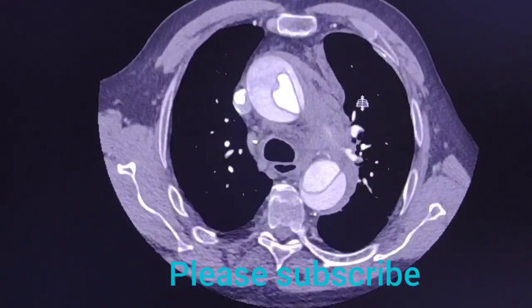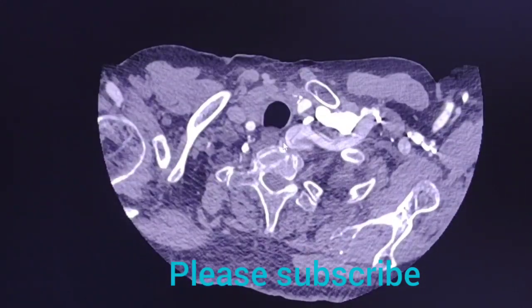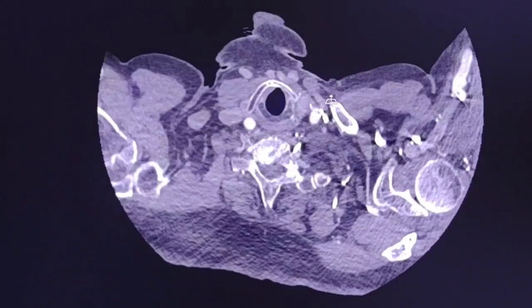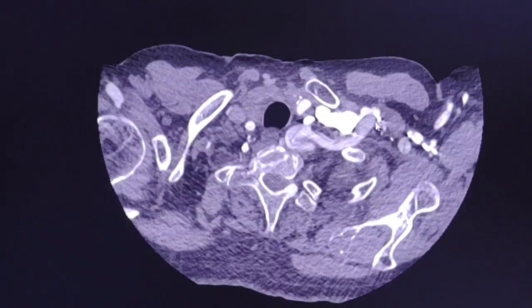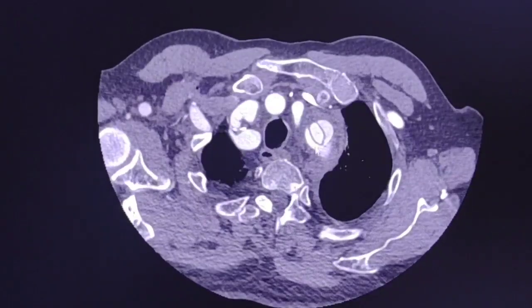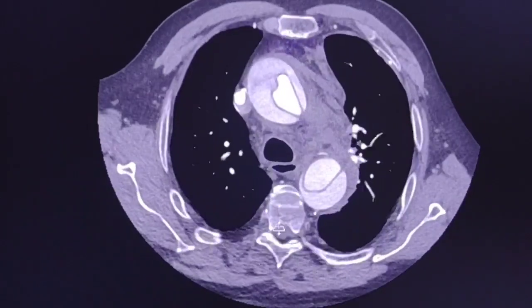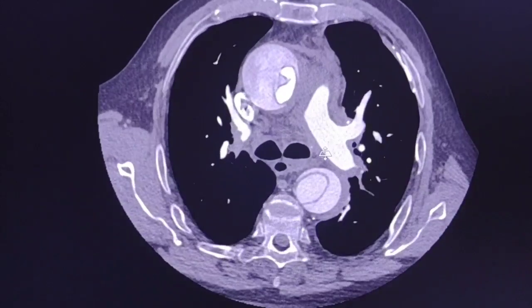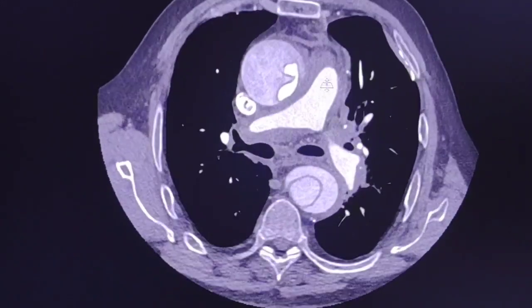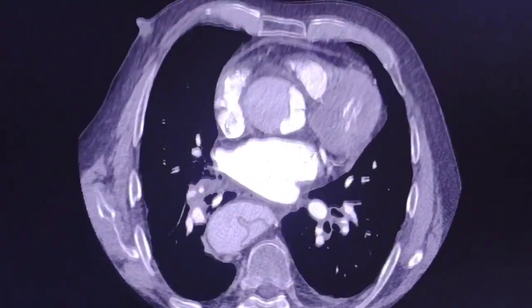So let's scroll the images up and down and have a look. Just keep in mind to see all the vessels. Here is the left subclavian artery. Here is the dissection flap. The mediastinum. We will discuss this a little later. Just have a first look at the images.